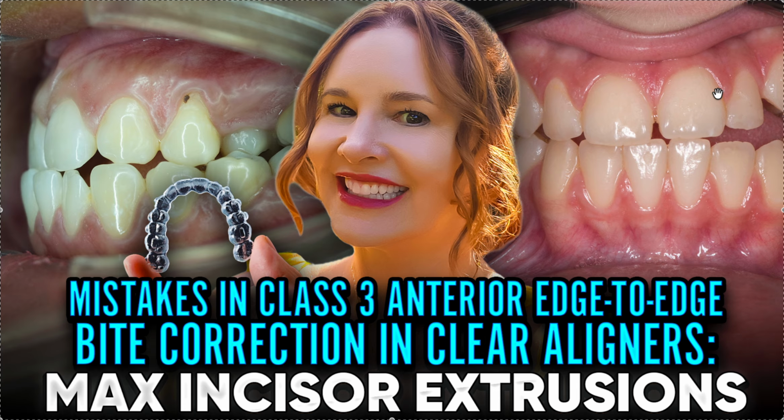So now you guys are understanding that if you don't think about your case, you just import your case, click this engine, I'm not going to say the names, and just let them do it for me through my preferences, oh my God, you're getting this AI cookie cutter bot outcome. I'm going to start trademarking this: AI cookie cutter bot orthodontic outcome. That's it. And I can spot these cases.